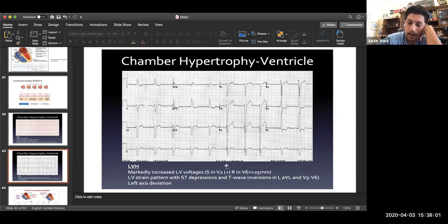Okay. What else did I want to say? I think that's it for those. You see some ST stuff going on here, but that's still consistent with the so-called strain pattern. Okay.